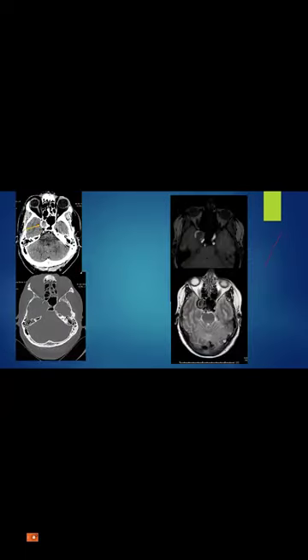Again, another potential miss is in an area of very variable anatomy. Maybe you would think this is a retention cyst in the sphenoid sinus, but this doesn't look like it. You need to raise the concern that there is a round, calcified, mass-like thing. It is actually an aneurysm.